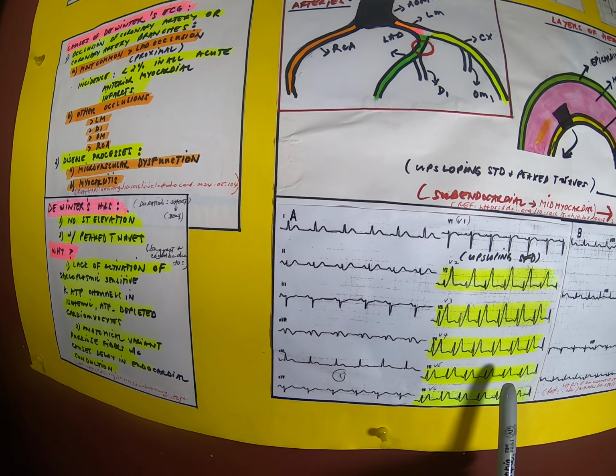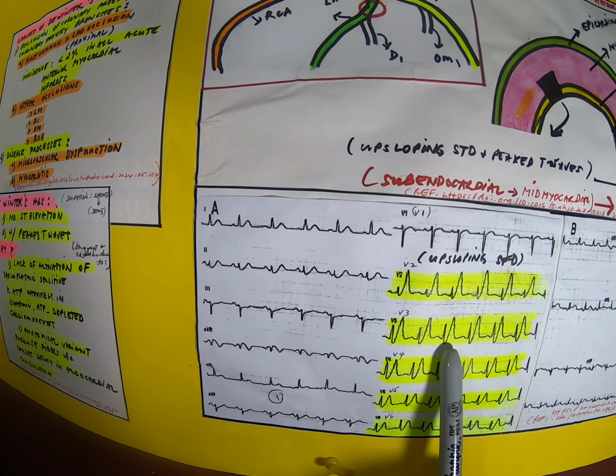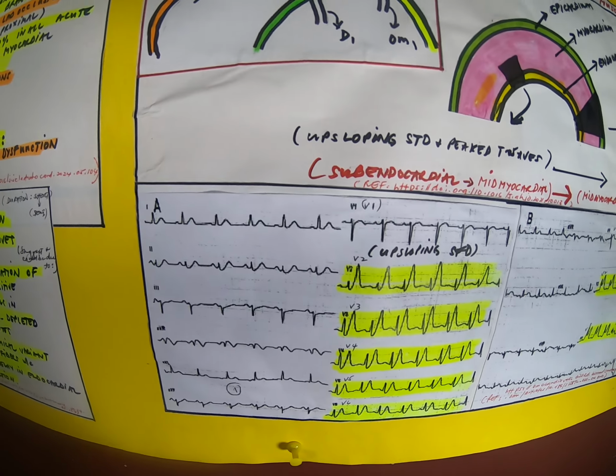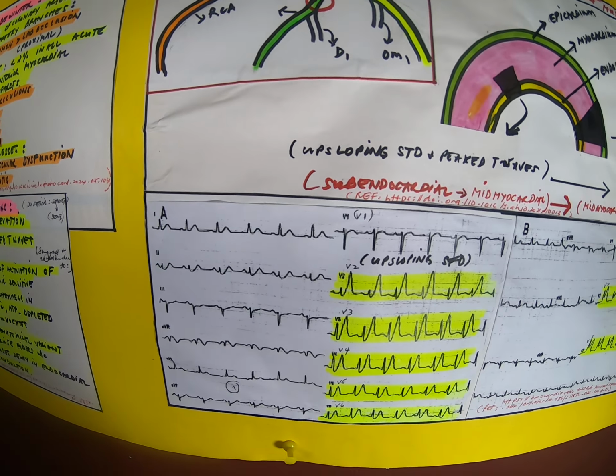Okay, so a patient came in, and this is the precordial leads with upsloping STs here. So this one looks like type 2. Okay, but the most common one is type 1, but our example here is type 2. So you have here a slight, actually this is an ST depression downsloping and pulling upward, becoming upsloping. So anyway, the question is why we have these big T's and everything.